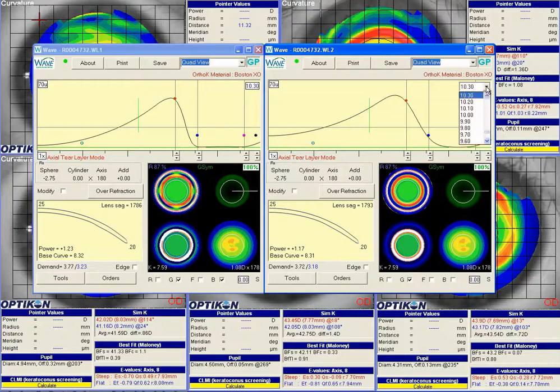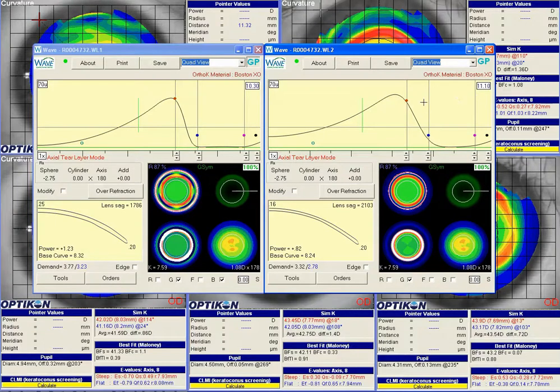11.1. So what that does is it also changes the position of the OZ and IC, and we need to readjust those. Originally, they were at 6.2 and 7.2. If we want to move this one back to 6.2, I think that's fine.